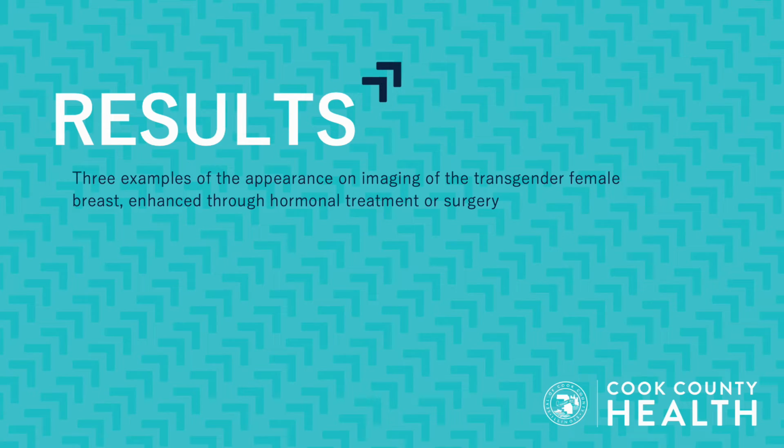I'll be going over a few cases of the appearance on imaging of transgender female breasts, either enhanced through hormone treatment or surgery.